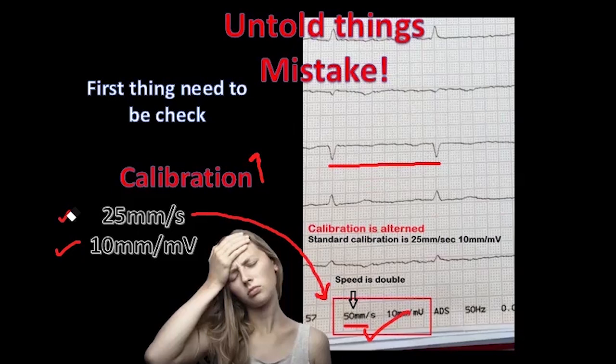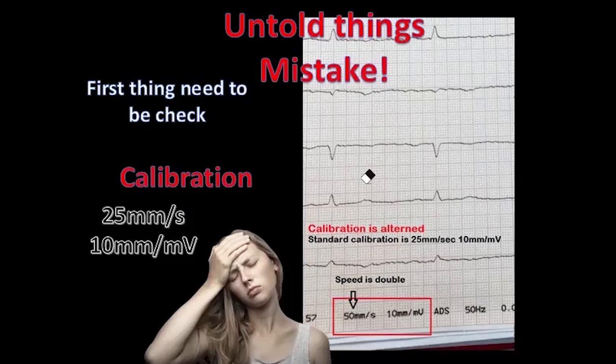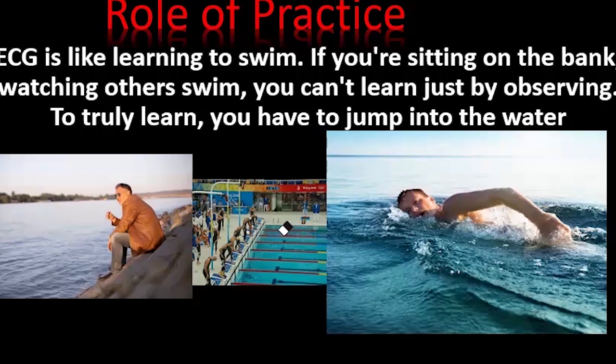So this is also an important thing you must consider when interpreting an ECG. It's okay right now, we are learning, but if you misdiagnose this case in a real clinical scenario or treat it as bradycardia, then it could be fatal.